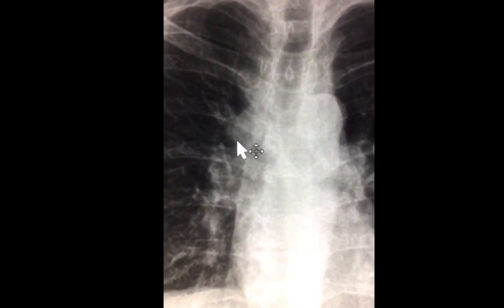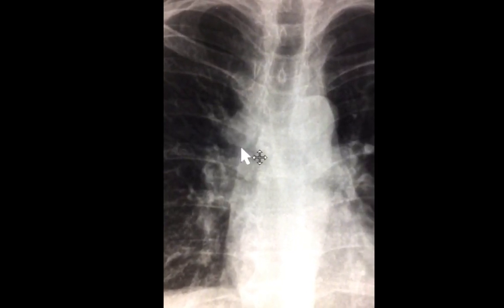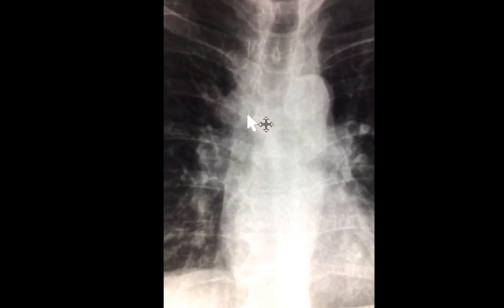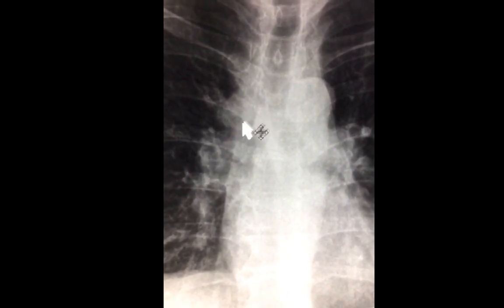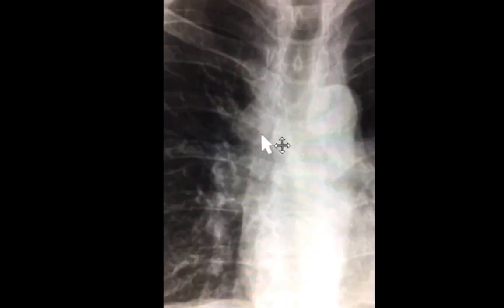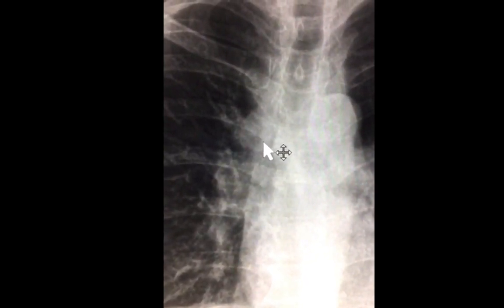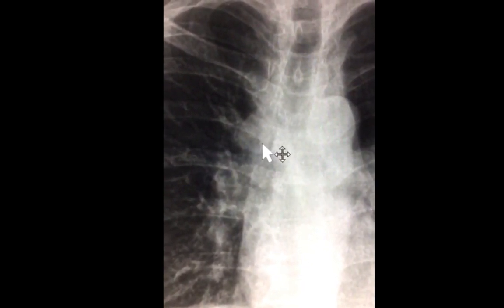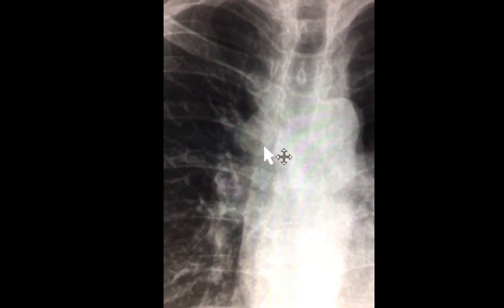The bulge is protruding over the lung parenchyma to a degree that exceeds the expected azygos distension. Practically speaking, it's difficult to differentiate what is an azygos abnormality from a non-azygos abnormality if you cannot see the azygos shadow here. In an older clip, we discussed the azygos course and anatomy, and we also discussed the differential diagnosis for its dilatation. So if this is not an azygos abnormality, what else could it represent?